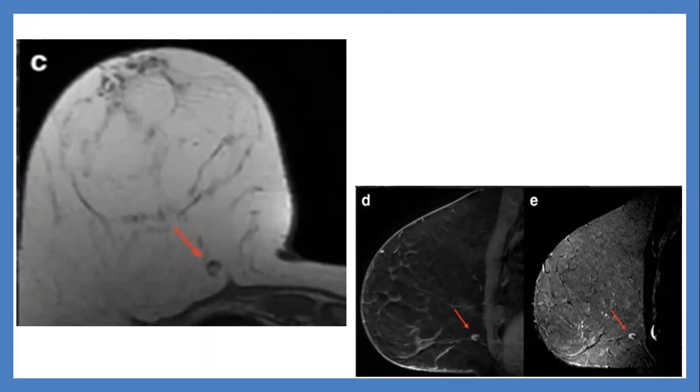The cortex shows uniform contrast enhancement. Yes, uniform homogeneous contrast enhancement. How does it appear on T2? It is high on T2, and it demonstrates homogeneous enhancement, which can be intense. And what about the kinetics?